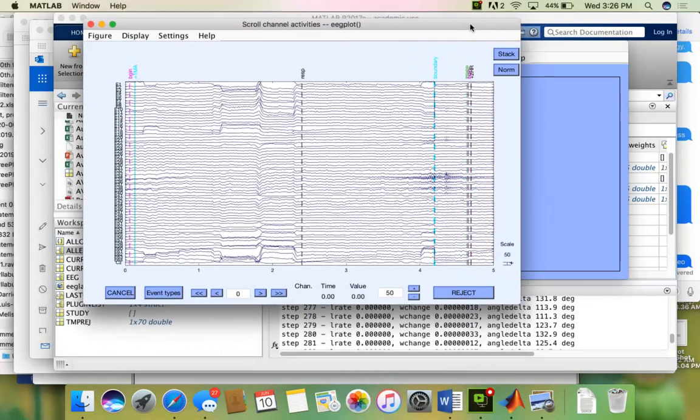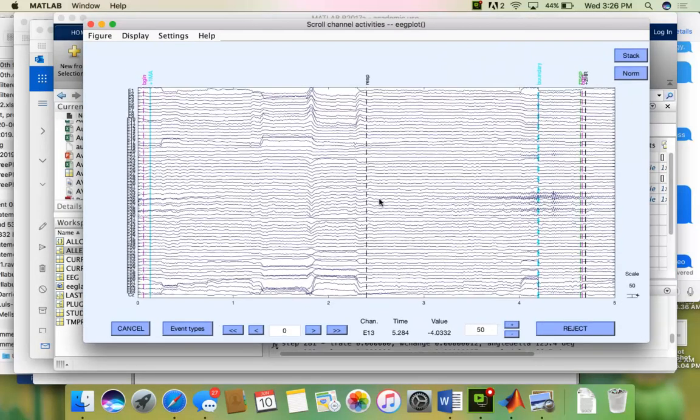So you remember I showed you the photos that we displayed to the person. I want to look at these markers and explain what has happened. Begin is basically the EEG system starting itself. It's just an arbitrary point, and I'll explain the reason in a minute. If you see this +1 MA, that is Mad Avatar, the first picture. Notice that it presents a little after the system is told to begin.